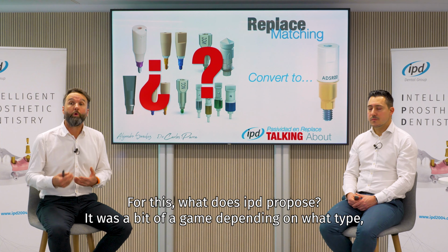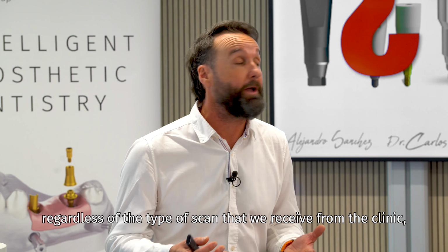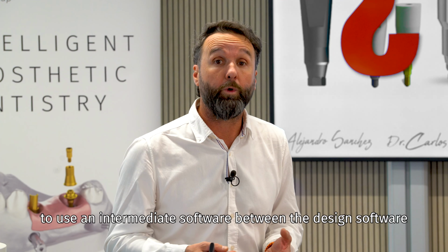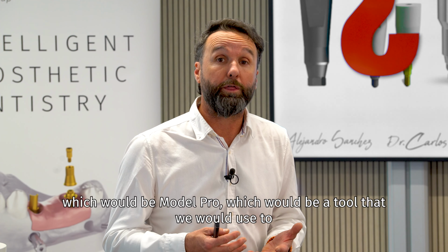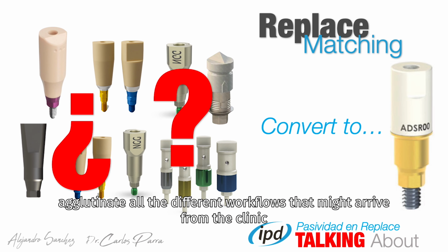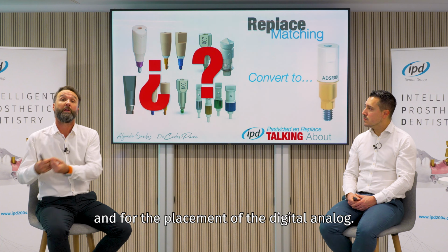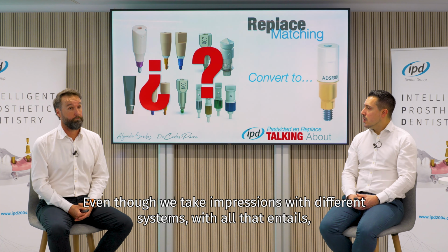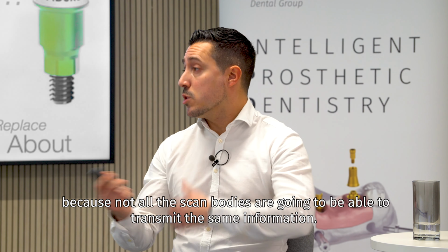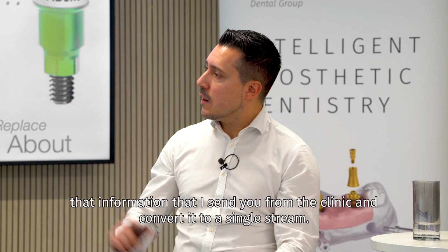It was a bit of a game depending on what type. Regardless of the type of scan that we receive from the clinic, to use an intermediate software between the design software, which would be Model Pro, a tool that we would use to agglutinate all the different workflows that might arrive from the clinic in a single line of work, that would be IPD, both for the reconstruction of the prosthesis and for the placement of the digital analog. Even though we take impressions with different systems, because not all the scan bodies are going to be able to transmit the same information, the software is able to bring together the information that I send you from the clinic and convert it to a single stream.